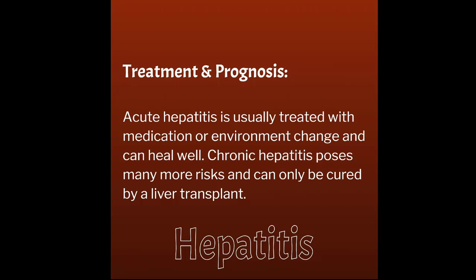When we're looking at those hepatitis B, hepatitis C patients that have moved into the chronic side of things, those are the patients that we see every 6 months, every year. We're following the progression of the disease and what it looks like on their liver. They cannot cure it at this point, so we are just making sure that the liver still functions well, looks relatively normal, that there aren't any tumors or anything like that popping up, no ascites for the patient, all late stage risks of a damaged liver.